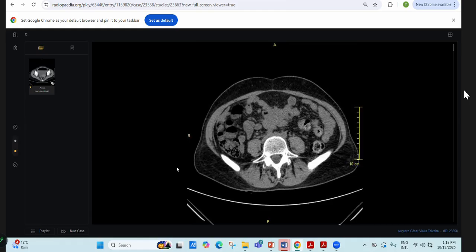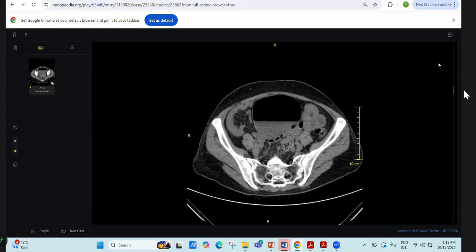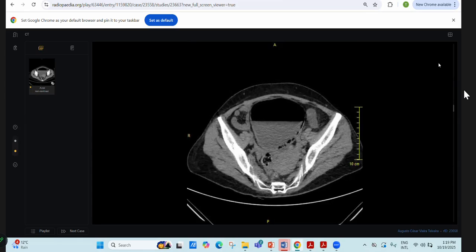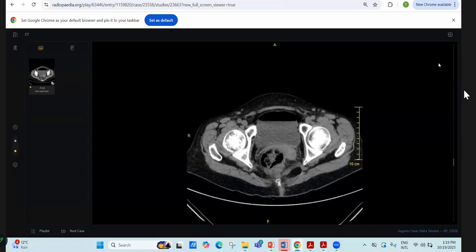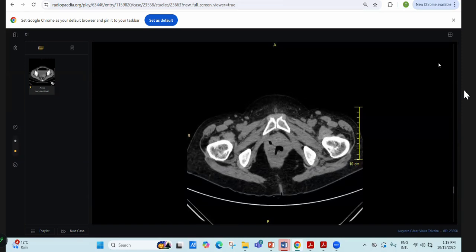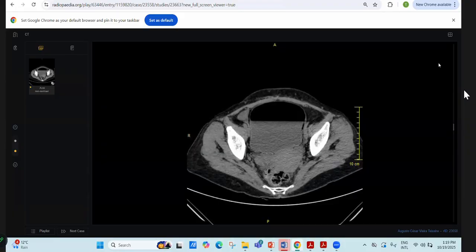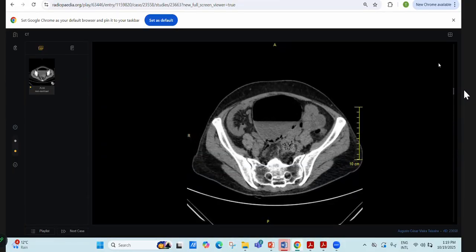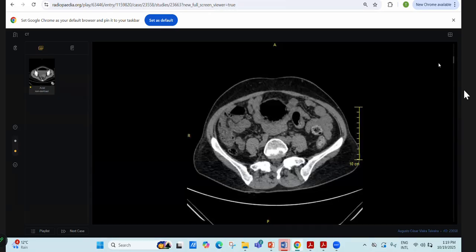So this is the CT of the same patient? Yes. Okay. I can see air fluid level as well as air within the bladder wall, which is grossly distended. I cannot see any free fluid. I'd like to see the kidneys as well. No, there are no kidneys.